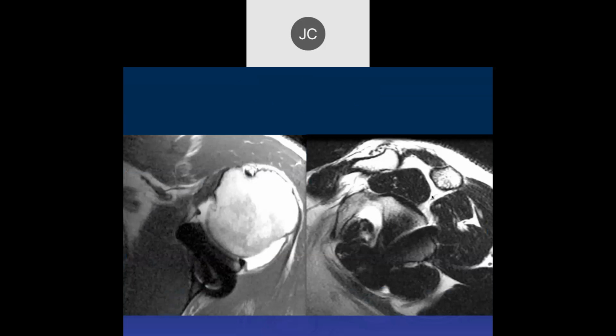It looks like the suture anchor is too high, but okay. I'm here to criticize, John. All right. We wouldn't know. My job in life. Okay. Well, we'll end on this case maybe.